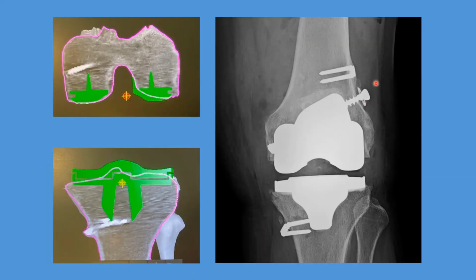And so we can see from our post-operative x-ray, we've restored the anatomy, we've corrected the arthritis, but very importantly, we saw this hardware that was in the higher portion of the femur was never in the way, didn't have to be removed. This staple went right in between the implant, didn't have to be removed. The ACL staple had to be removed, but this MCL staple, which is in this area, securing the MCL, could be maintained to give ligamentous support along the inner side of the knee.